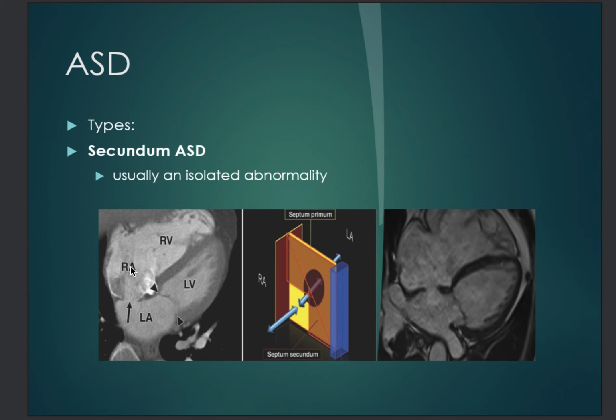On a CT, for example, if you see backflow of contrast in the IVC, this might indicate tricuspid regurgitation or volume overload. If you see septal bowing on MRI, for example, or on a functional CT, with the convexity to the left side or flattening of the septum, this might indicate a high pressure in the right ventricle. All those points are important to comment on in the report, either to include or exclude, because this might exclude closing the ASD if there is pulmonary hypertension or Eisenmenger. A very important point to comment on is whether there is a partial anomalous venous return associated with the ASD or not.